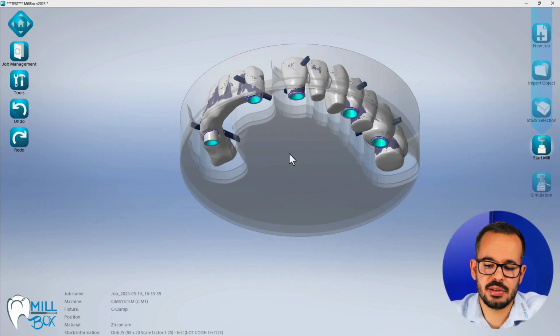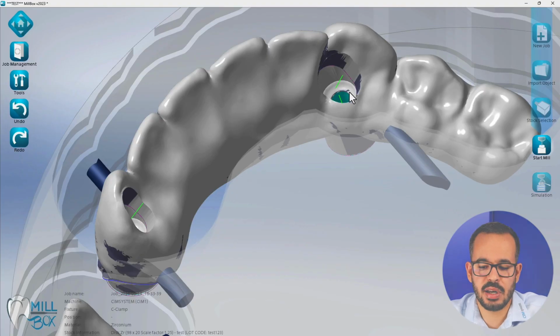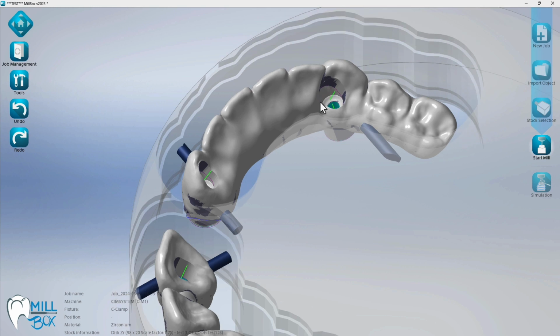For those cases where I have a special screw seat, the screw seats are not flat or not a cylindrical shape, like conical. They might have a really long cylindrical area, with a cone or with a round up mesh like this one. This is a Powerball. So in order for us to mill this case properly, we need to apply custom strategies that come along with the replace library to properly mill those areas. When we are replacing those interfaces, the software is auto applying those strategies for us.